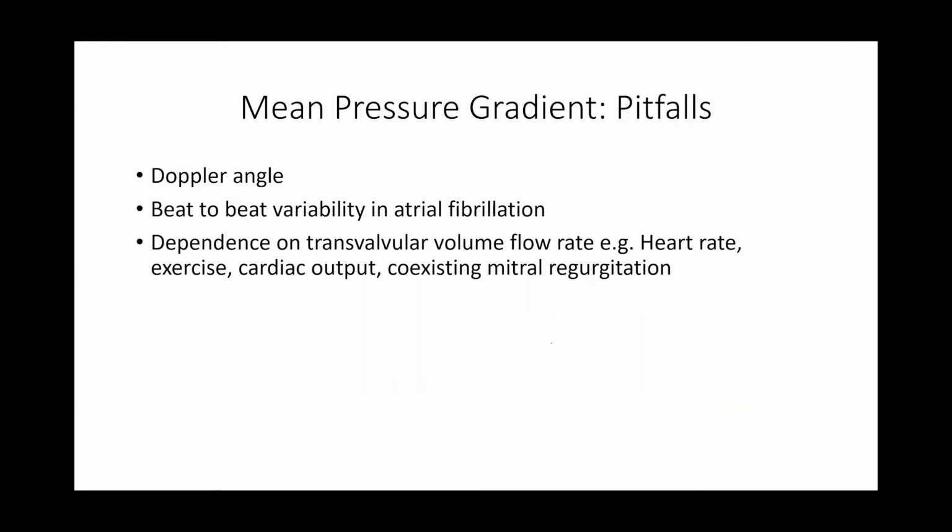It's almost the same kind of pitfalls. Again, you need a good Doppler angle. Atrial fibrillation is a problem because there would be variation every beat. And again, it's dependent on flow conditions, heart rate, cardiac output, and also coexisting mitral regurg.